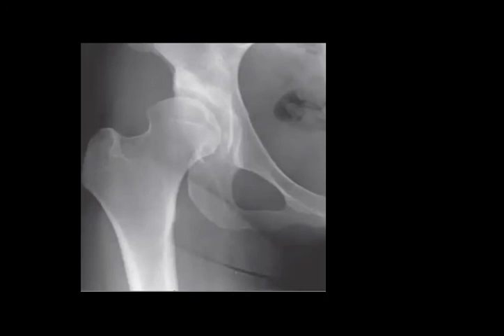What is the problem here? Maybe we can approach, is it the problem in the acetabulum or the femur or both? Or maybe we can start with the acetabulum. Okay, so what is the acetabulum here? Are you happy with the coverage of the acetabulum? Is it over coverage or under coverage? There is deficient acetabular coverage. Yeah, so under coverage.